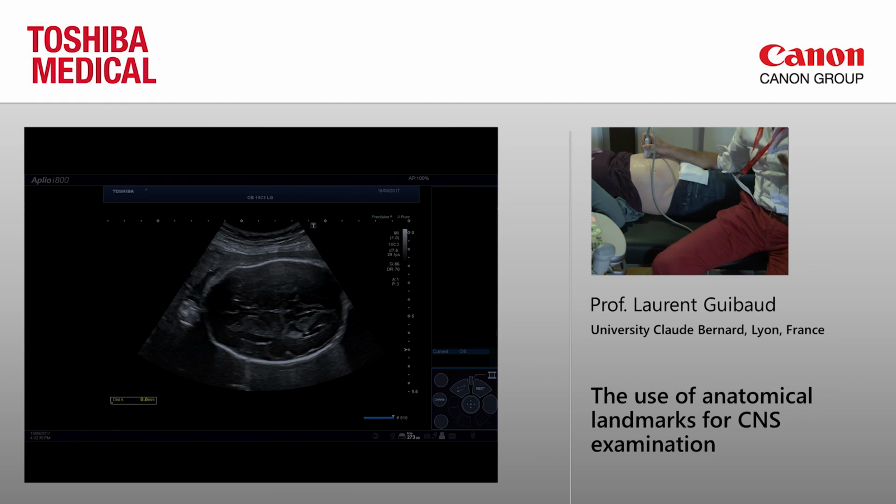In very severe CMV, you have microcephaly and very large pericerebral spaces. So the pericerebral spaces are a very good clue when you have a ventriculomegaly, a macrocephaly or microcephaly, to have an idea of the etiology.